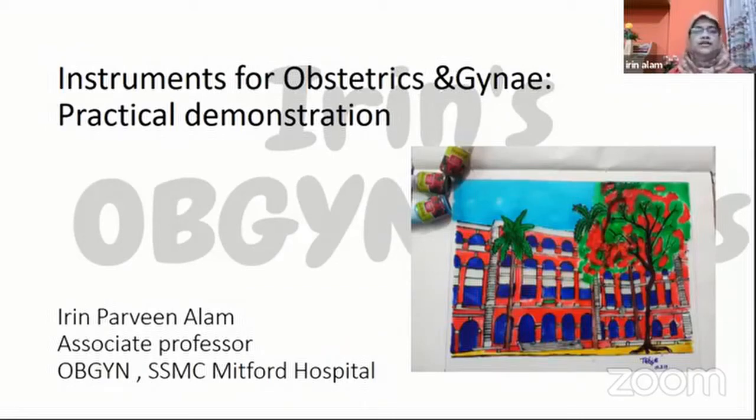Dear students, today's topic will be instruments for obstetrics and gynae. Instruments usually come in your OSPE exam, and related questions may also be asked at any time during viva and during SAQ. So today's topic is instruments for obstetrics and gynae.